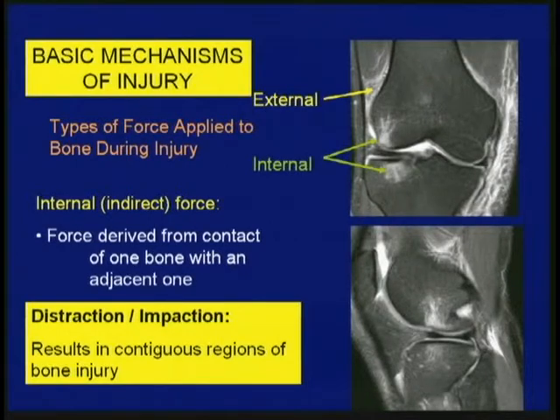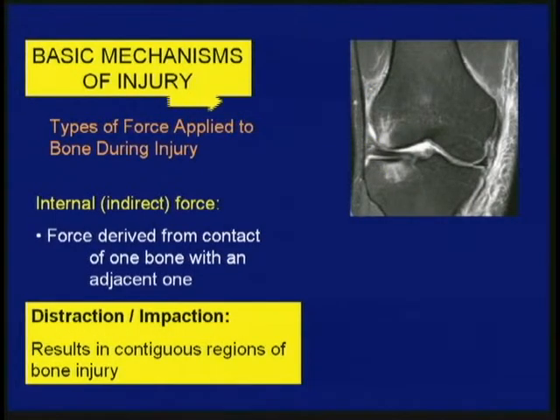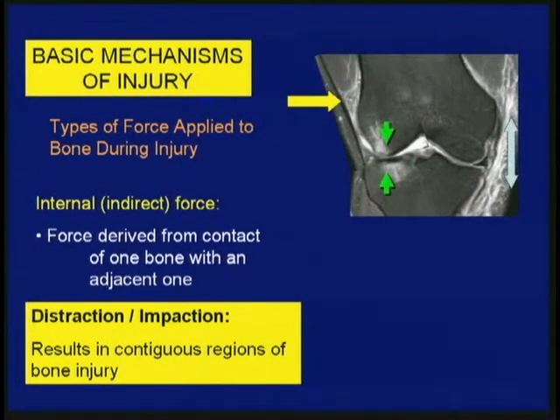And the ones I chose were chosen because we had very good histories. They're not always the best images. I'm indicating with these arrows exactly what happened, but I'm going to show you as we look at this what happened during the injury. This is what happened. This patient was struck above the level of the knee joint, throwing that knee into a valgus alignment.